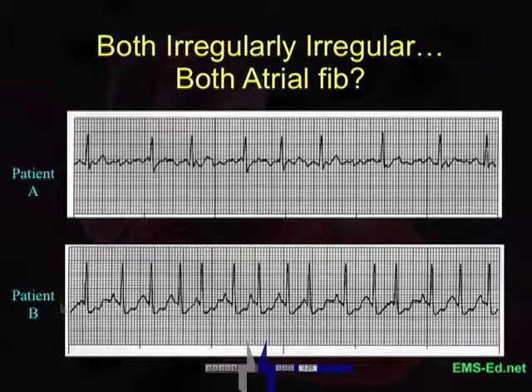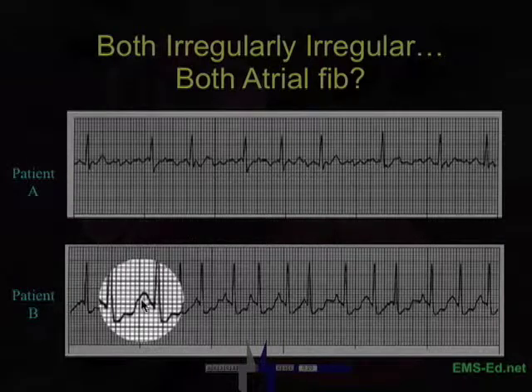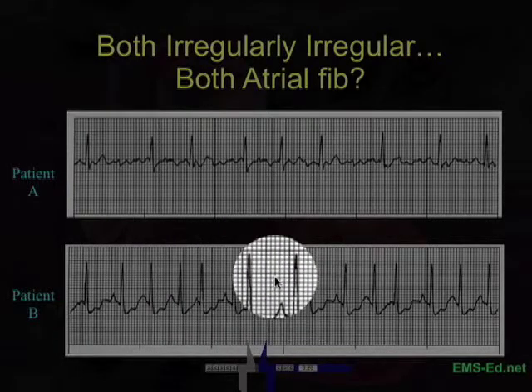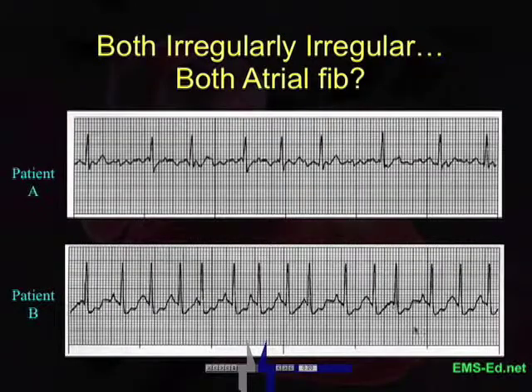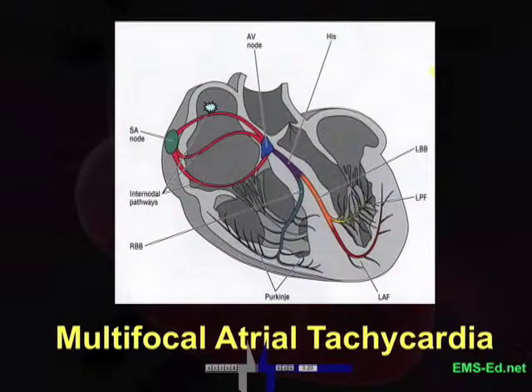But look at these P waves closely. Look at this one. This one's a little bit more broad. This one's real pointy. This one's very pointy. Rounded, almost indiscernible. What is going on here? Well, this is what's going on.